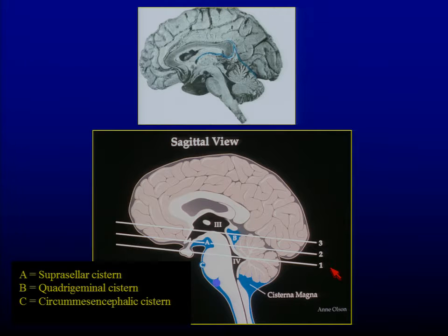And there's really three key slices that you're going to see on a head CT where a lot of stuff happens in a very little space. And there can be subtle findings there that can explain an awful lot of what's going on bad with the patient. So the first key slice that I always pay extra attention to be sure I'm looking at is at this first level right here. It comes through the middle of the cerebellum. I catch the fourth ventricle. I catch the brainstem.